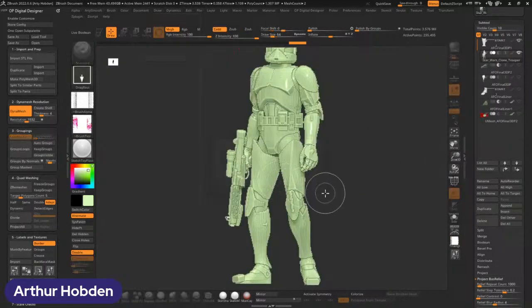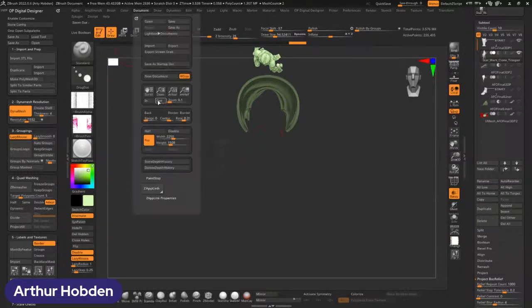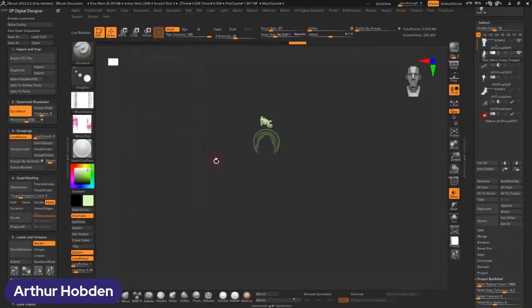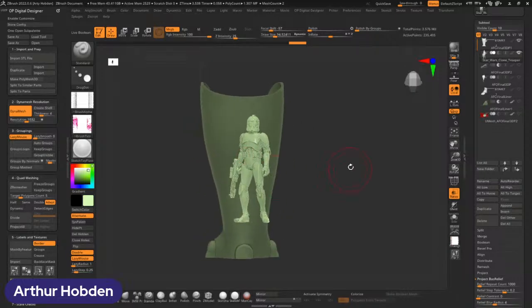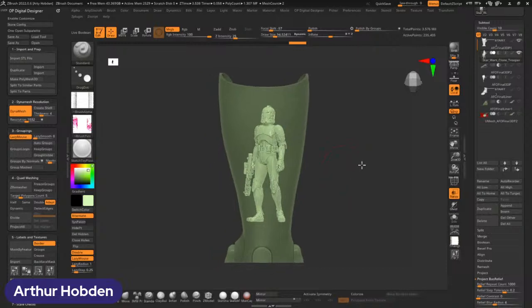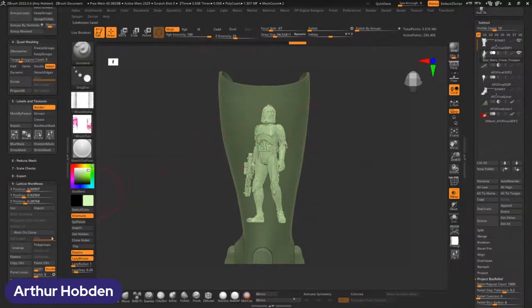double my screen size, because funny enough, ZBrush uses a 2D canvas to project a lot of these commands, which is why it's so quick to render millions of polygons. You got to run your canvas at a higher resolution sometimes to make it work. So now that we've set it up, we want this image to be on that device.